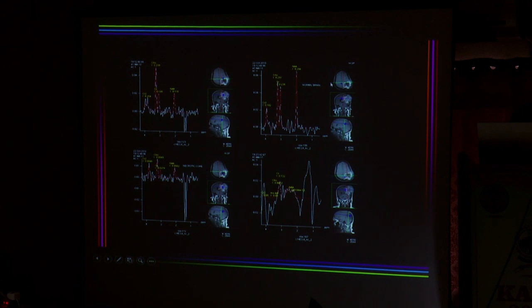And this is a multivoxel MR spectroscopy. As you should know, you do a multivoxel to compare with the contralateral normal brain parenchyma. So in the normal brain, you don't see a lactate peak. And for choline, you don't look at the peaks, you look at the integral values. So the integral value is around 0.25, and when you compare within the lesion, the peripheral irregular necrotic rim, you can see the integral values are relatively the same. So there is not much increased choline integral value, although in many cases you may not get a good spectrum like this.